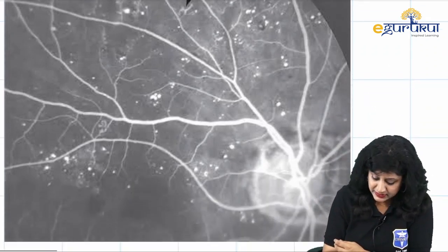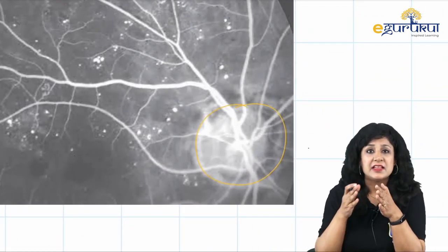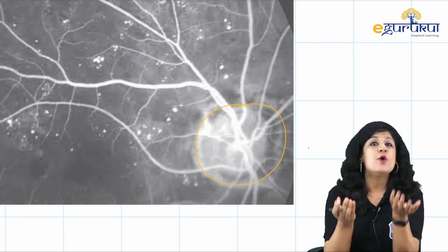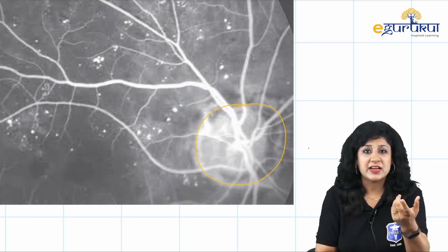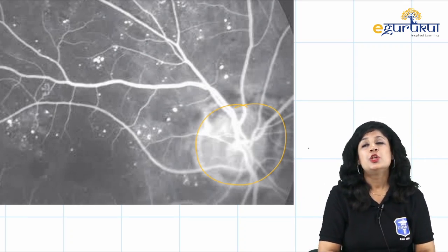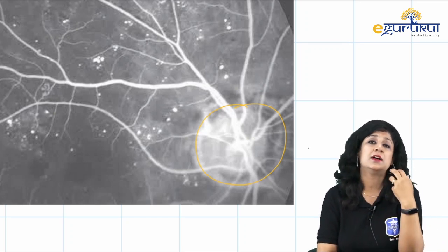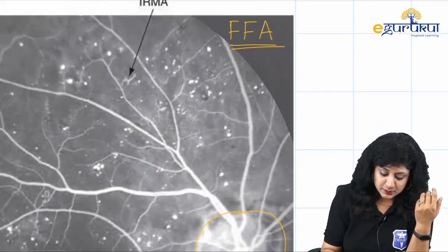Can you see this? Okay, this area will be your optic disc. Then you can see the blood which is going in the major blood vessels, right? We have hypofluorescent and hyperfluorescent areas, so there are two. One is your whitish areas and one is your darker area. So hyper is a white area where there is fluid, because of the blood, dye is going there.